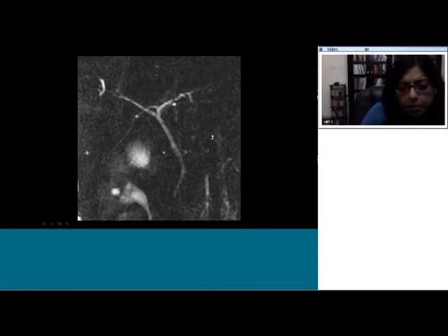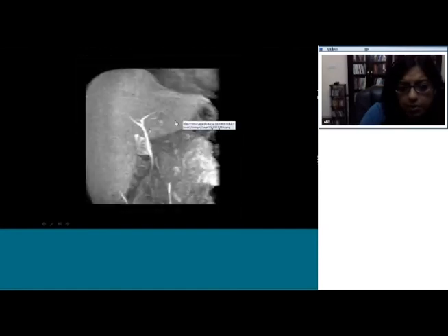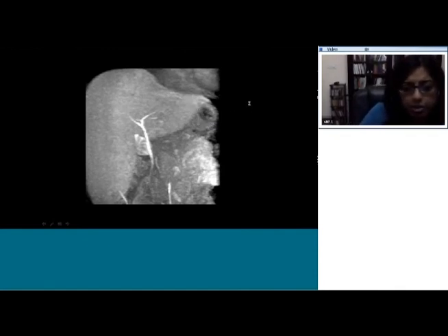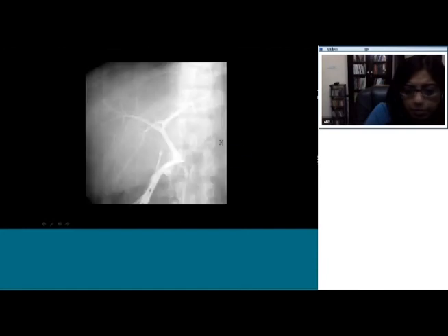Okay. And these are the same thing. It's more difficult to see. These studies are pretty challenging to do. MRCP can show, but sometimes they don't have the degree of resolution that one can get. So a commonly used study is a CT cholangiogram, where the cholangiographic substance is injected intravenously and the patients wait for 2 hours, and then they are scanned again. And this is an ERCP of the same patient, confirming that's actually a T2.